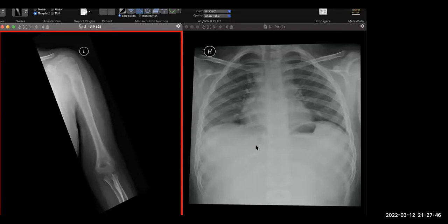All right, so at this stage, since the child had some chest symptoms, but the chest X-ray does not show much, I'm unable to pick any significant finding on the chest X-ray. But I could not leave the bony findings, which appear to be a bit aggressive ones.